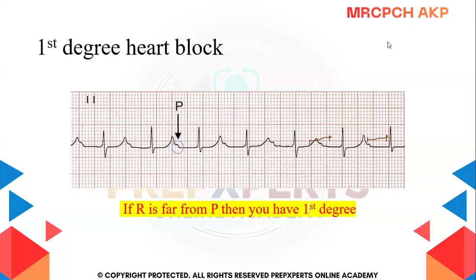There is nothing troublesome here so far. We just have to observe, and obviously see what the risk factors are in this patient and then manage accordingly. But so far the heart is doing fine. Let's see what happens in the second degree heart block.